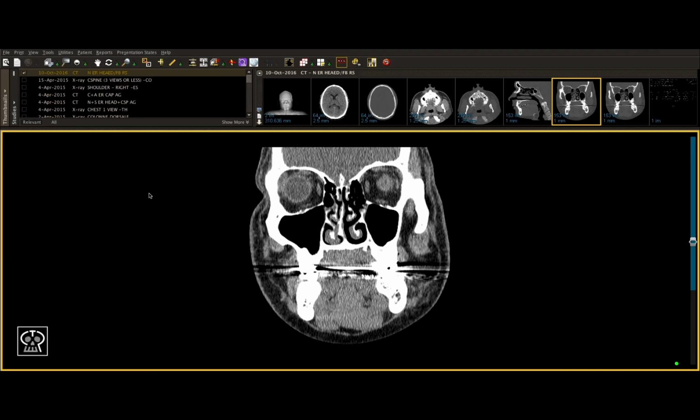Although we use the bone window to view all our facial scans and look for fractures, this is a good example of a time in which switching up the window can help provide more information and make it easier to see if muscle entrapment occurs. Remember, muscle entrapment is a clinical diagnosis and you must confirm it on your patient's physical exam.